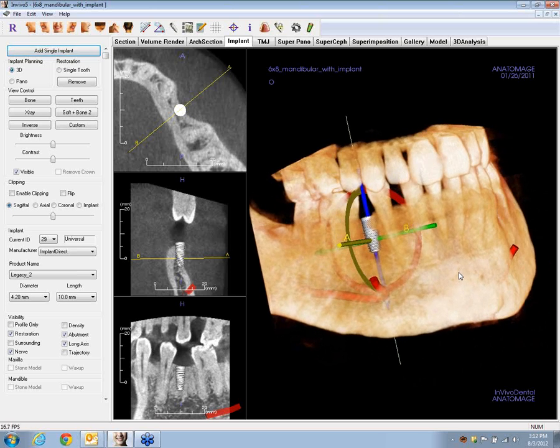You understand what's going on. This looks like a top view, but that's not really the whole truth right now. What we're looking at could be construed as an axial view, but the planes are perpendicular to the long axis of the barrel of the implant.